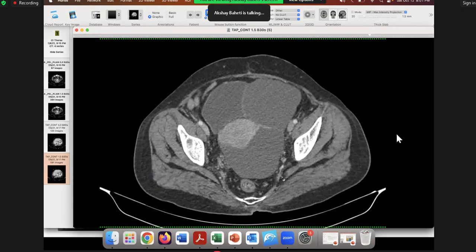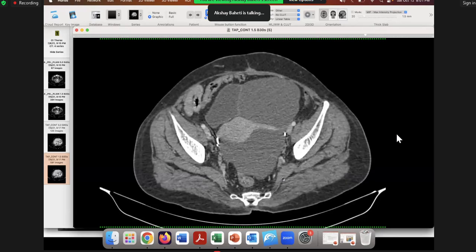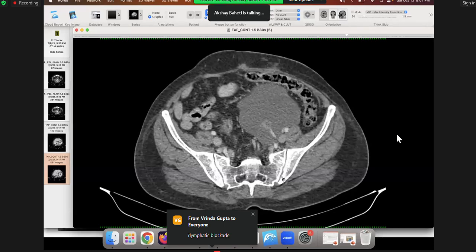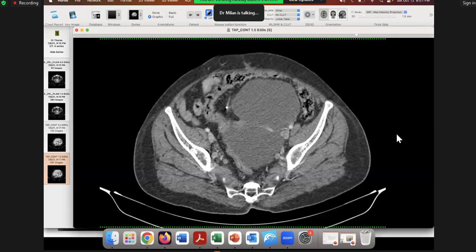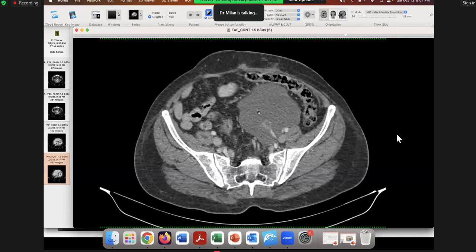So you said there's history of surgery, and I see this, and hence I'm calling it a peritoneal inclusion cyst. Why is the history of surgery important? Others will say history of surgery makes me worried because there's history of cancer. So why is this not cancer? Why is this a peritoneal inclusion cyst? There can be adhesions which form, and then fluid will get collected within the locules, and then it forms the inclusion. Why will fluid collect only here? Why not elsewhere?